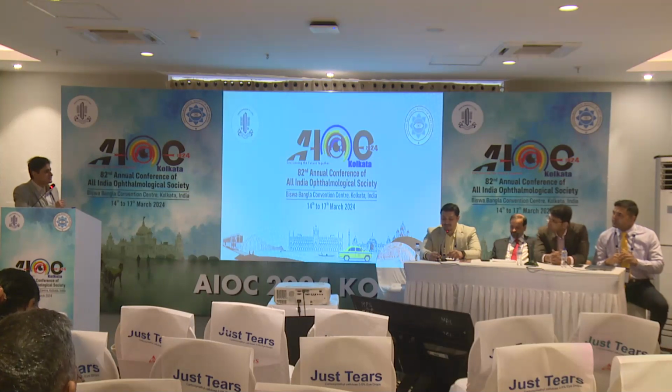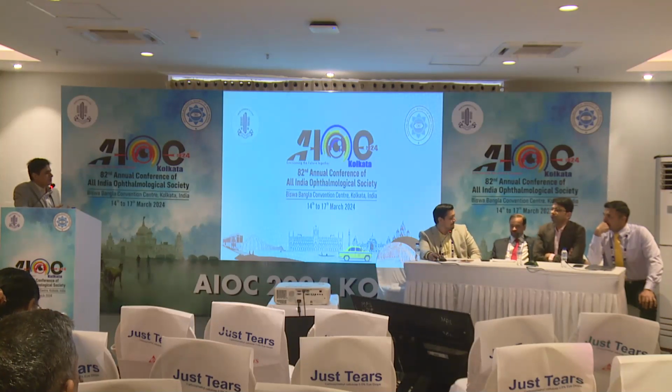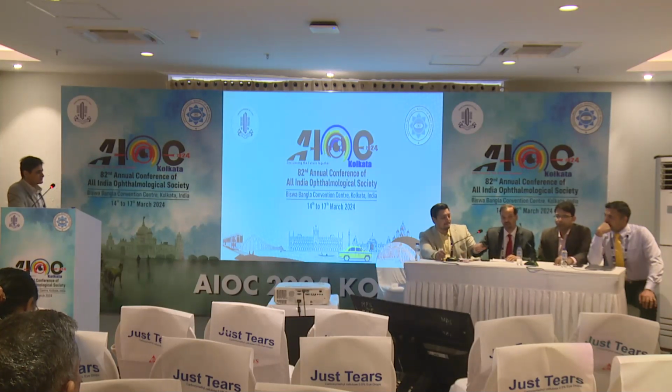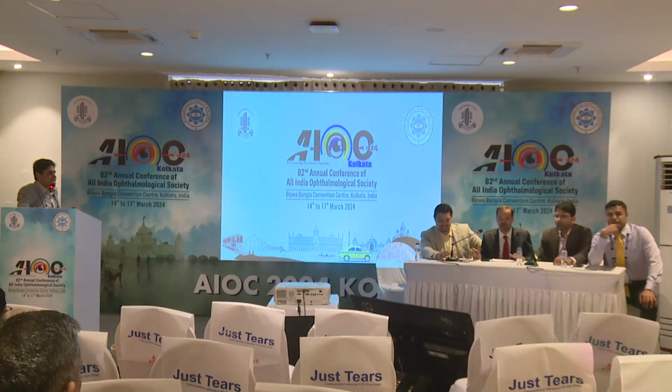I just wanted to ask, since you are working in an institute with your higher end machines, do you see on OCTA any polyp which we are probably missing, or any other information we can get on PCV? You see an ICG of PCV, just the ICG, I think 99% of the people would be able to tell that this is a PCV. But you just show an OCTA, just the OCTA, to anyone, and only 5% of people will be able to tell that this is a PCV. I'm talking about a single imaging modality. But once you combine OCTA with OCT and fundus knowledge, everything put together, yes, you can get a fair bit of idea whether you are dealing with PCV or not. But that's why the ICG remains the gold standard.